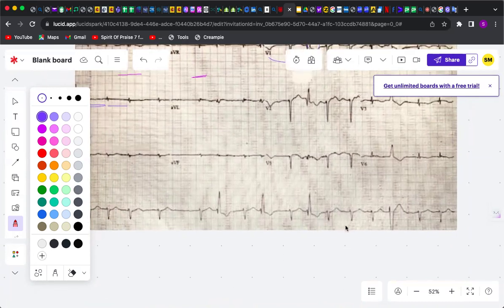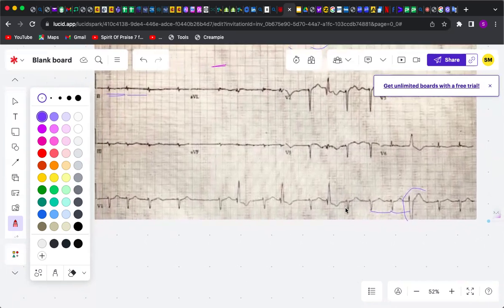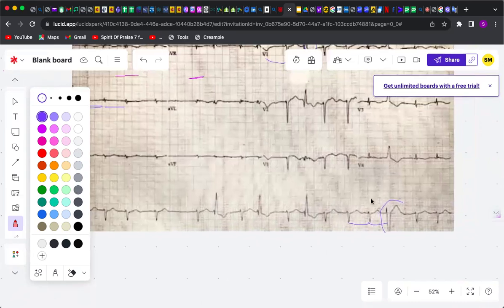Sometimes, for instance, you could have PVCs in there. For instance, when you're having equal RR intervals and then you're having such a morphology, and it's not showing the typical right bundle branch morphology, you could say that this could not be an Ashman beat, but rather a PVC.